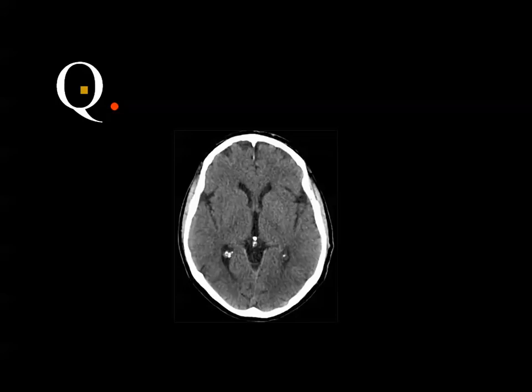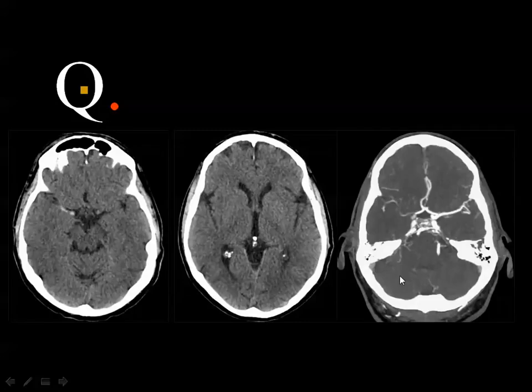Axial CT scan of the brain, soft tissue window, normal. This calcium is normal in the pineal body and in the choroid plexus. The only difference here is the difference in the size between the occipital horn on this side, which is a little bit attenuated.